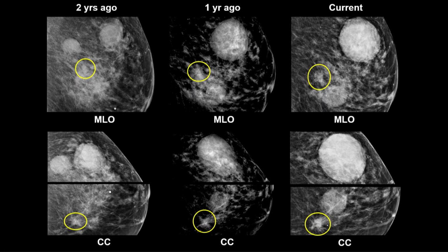Do not interpret this one as enlarging suspicious mass, because that will be an invitation to a plaintiff lawyer to subpoena you to testify against whoever read that one, who is probably one of your partners, or maybe even yourself. So just say there is a spiculated mass. Don't say there is an enlarging spiculated mass.